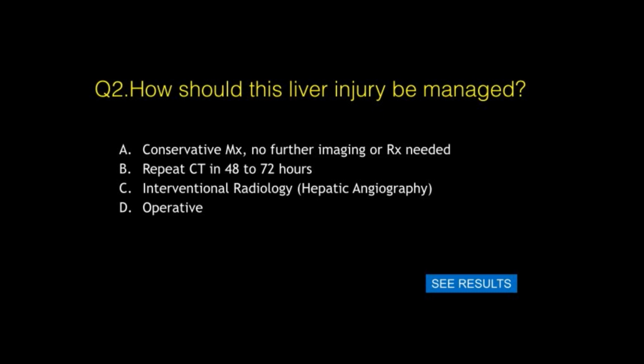And then when we look at the liver itself, you can see that the laceration is going all the way to the porta. So that's another significant sign, isn't it? That there's quite a significant injury of the liver. Okay, so this is a grade 5 liver laceration.